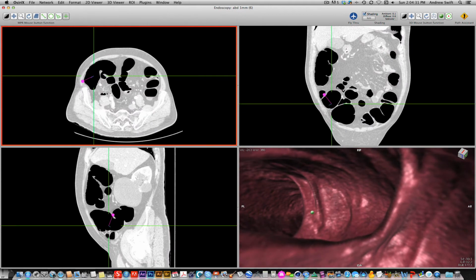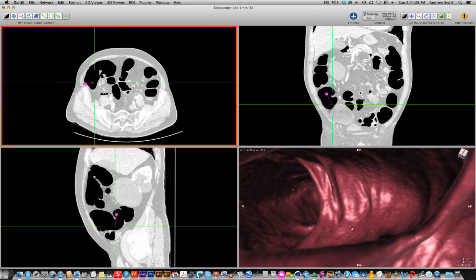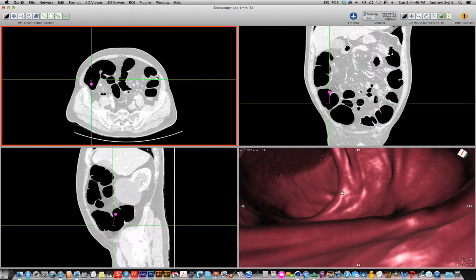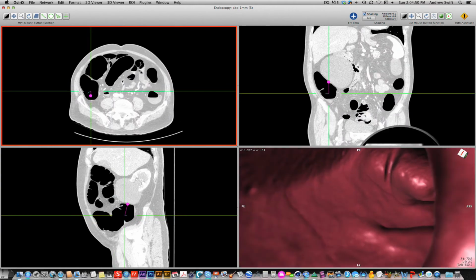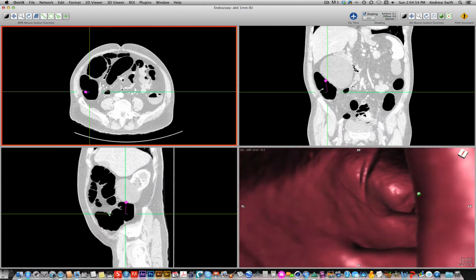And you can use the same movie making features if you wanted to make your movie here. And like I said, you can create the same window leveling effects we talked about before. I don't know why the lighting on that is so bad, but it is. But this gives you an idea, and this is like a lot of things, you just got to play with it until you get the hang of it.